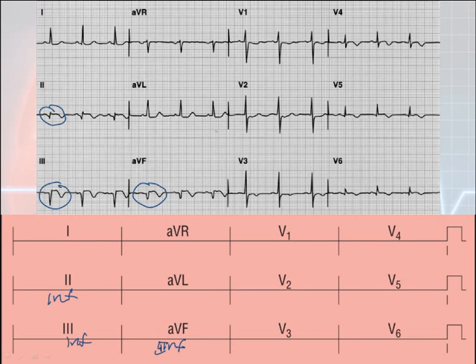It looks like everywhere else is ST-segment depression, which would be a reciprocal change, and we're going to talk about that a little bit. V6 might look a little bit elevated rather than depressed, and maybe V5. Kind of hard to tell. There's definite T-wave inversion right there, though, which tells me that there is some ischemia going on in the lateral area. So we could definitely say that this is an inferior wall MI.